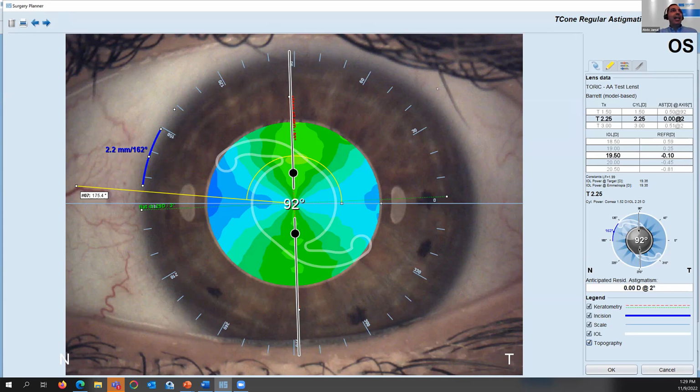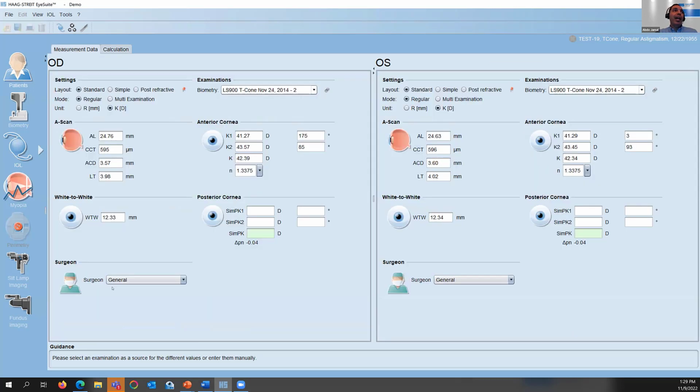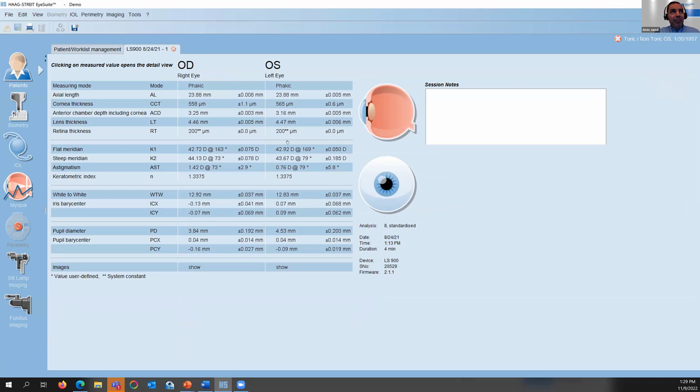One interesting case I want to show you here is about when you have a low astigmatism. Like here we have 0.75 diopter of astigmatism. And usually most of the IOL or the toric lenses start from 1 diopter correction. So let's go and do the calculation.